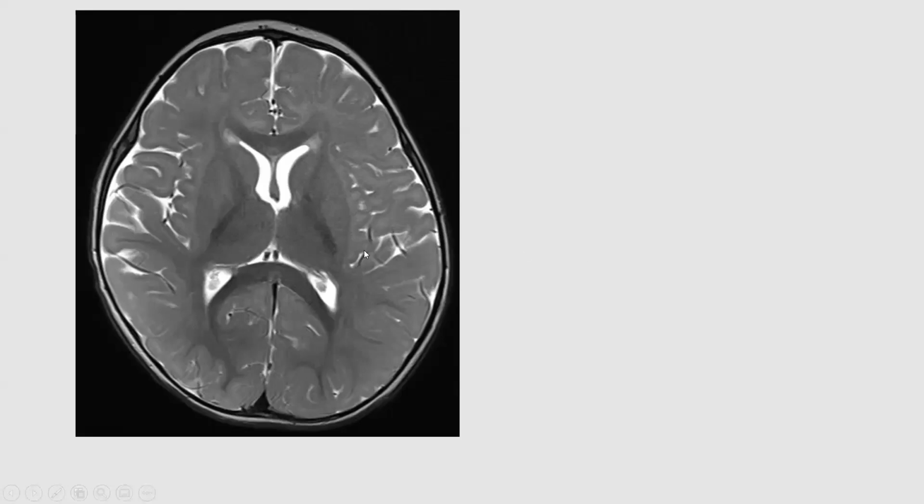And if you do not believe me that that is the case, let's then examine another patient. Let's first look at the T2 weighted images. There is more myelination compared to the previous patient, right? We see clear myelination in the posterior and anterior limb of the internal capsule. We see myelination in the splenium and also in the genu of the corpus callosum. And there is a difference in the signal intensity between the deep white matter and subcortical white matter of the occipital compared to the frontal lobe.